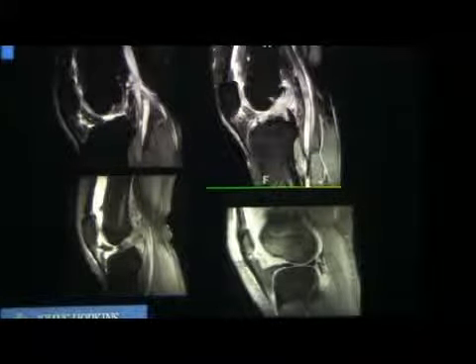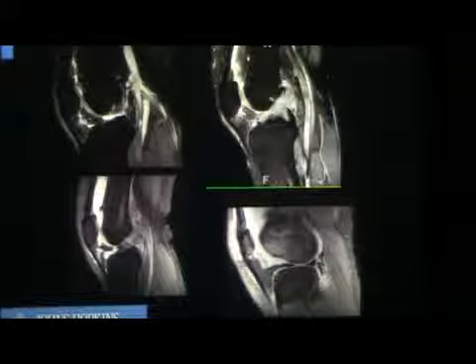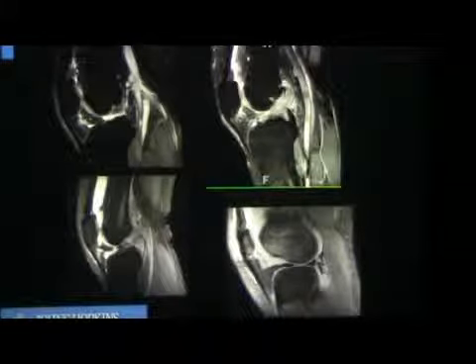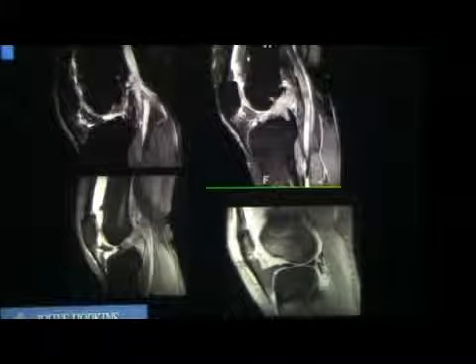Now the question is whether they are thickened or not thickened. So that's important. So you should know the location of plica. There are 4 plica: superior, inferior, medial, lateral. Easy to remember. Superior always forms the suprapatellar pouch. Sometimes you can have a thicker plica and you can have isolated effusions above the plica sitting there, which can present as a mass.